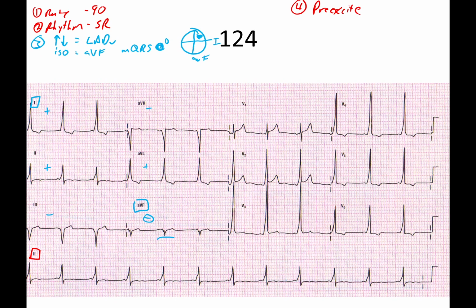And we're going to measure our PRI, and it's going to be from here to here or so. And that's really small. That's probably a 0.08, somewhere in that zone. And then we're also going to look at our QRS, which is probably on the order of 0.16. So pretty small, pretty big. And then most importantly, if you look closely, there's a nice big old delta wave right there. Fairly easy to spot that angle that it's going up at, right through there.